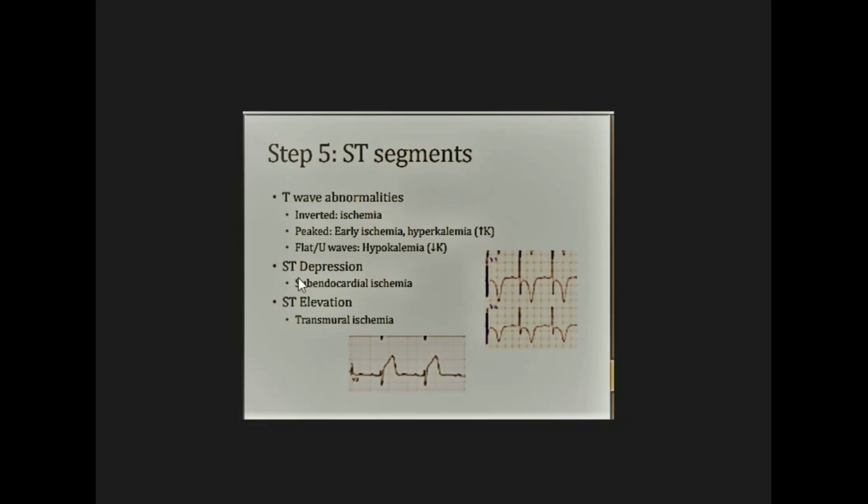If you're seeing ST depression, it can also indicate subendocardial ischemia, and if you're having an ST elevation, it is indicative of transmural ischemia.